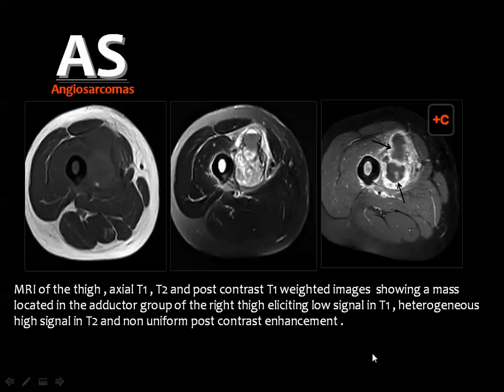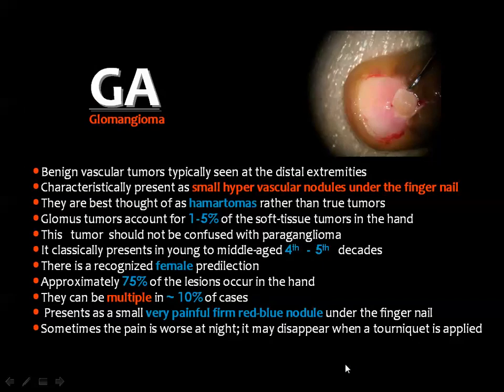with significant post-contrast enhancement. And you see here there is a mass of dark signal or intermediate signal or iso-intense signal to the muscles, and the T2 weighted images show mixed hyperintensities. And after contrast injection, you see areas of breakdown inside the lesion. Then this appearance can fit any of the sarcomas you know, and you should have the diagnosis by biopsy.